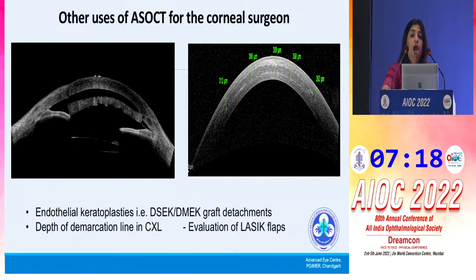Then one can see the depth of the demarcation lines in CXL to see how effective the CXL is. And then you can use it to see the LASIK flaps, what was the thickness of the LASIK flap in case of patients who need retreatments.